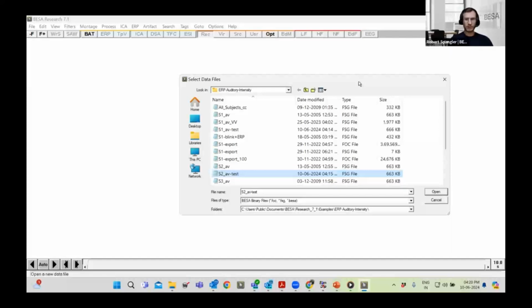You can write something like a sub batch for that and apply it to all your data sets, and then apply some different batches to other parts of your analysis pipeline. I found that really useful because you can limit yourself to smaller steps. And whenever you want to redo a step and adjust the parameters there, you directly have it at hand.